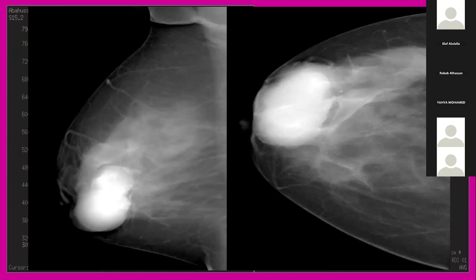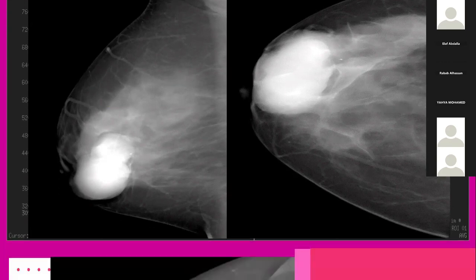And after that, the patient brought this image from 3 years before that study, demonstrating the papilloma that progressed and engulfed the nipple, but it was just multiple intraductal papillomas, central and peripheral.